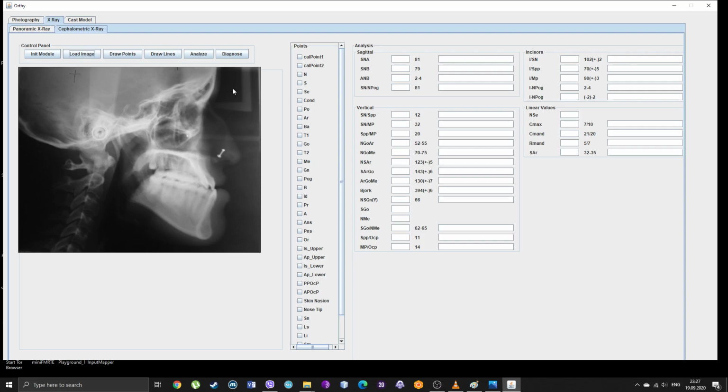points here. So, as I said in the previous section, a few minutes ago, if you don't have a calibration ruler, that's okay. You just draw your points anywhere, it doesn't matter, okay? And these values here will not work. That's all. Now we do everything again.